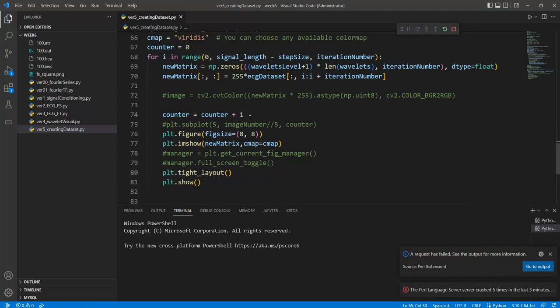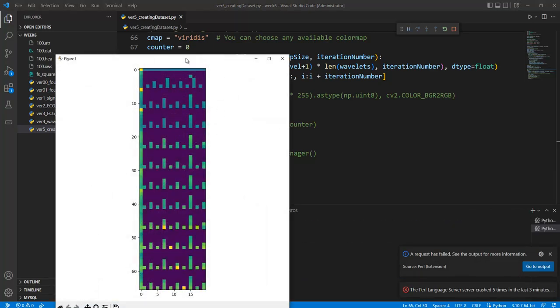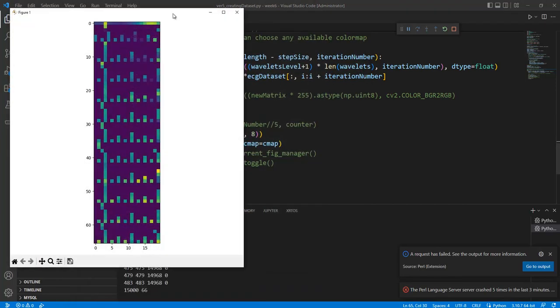We can convert or create one signal to the image, like this one. See? This is the representation of the ECG signal in a window-based time-frequency pattern. I can generate this image from the one-dimensional data. Okay? It's more meaningful.